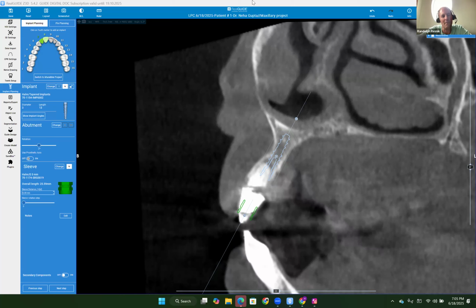Secondly, where that concavity is, it's very difficult to try to graft that area when placing the implant. It's kind of like a catcher's mitt pretty high up from where the tooth is there. So it's going to be difficult to determine if you've fenestrated it or you have a perforation when placing the implant. So those 2 reasons are going to make it very difficult to get an immediate implant in at the time of taking out number 7.